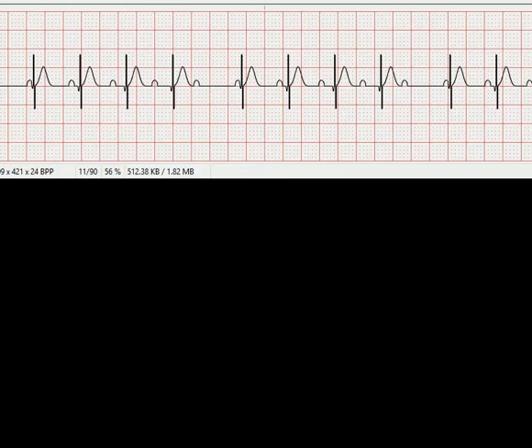So if you look at this one, QRSs are narrow, and this is unrealistically narrow. I apologize, that's my computer program, but nonetheless, they would not be like a half block wide. But either way, you have narrow QRSs, certainly not wide. P waves. Yep, we've got upright, round, symmetric P waves. PR ratio, is it 1 to 1?